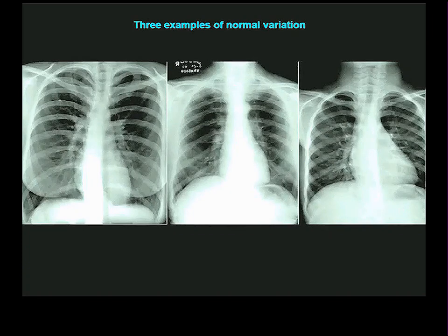I can't tell whether I can't see it here because of where I am or not, but sometimes you don't see it well because you've got the root of the lung there, which is hard. If there was an inferior vena cava, I know it's about right there, but here I can't even see where it would be. Inferior border, I know what it is, but I can't tell one chamber from the other because they don't silhouette each other. So I know essentially this is where the inferior vena cava goes into the right atrium. I know most of this is the inferior border of the right ventricle, and just the leftmost part of this inferior border, including the bend, that's the apex of the heart, is the left ventricle.